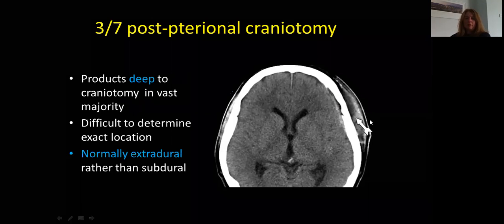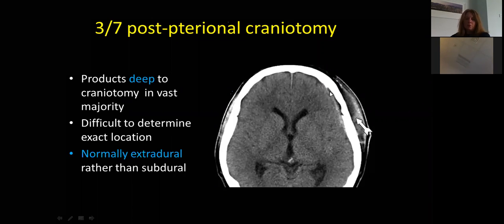And then if you look deep then to the craniotomy flap, this is really common. So most patients after a craniotomy will have this. They'll have some changes deep to the craniotomy. And it can be quite difficult to say if this is extradural or if it's subdural, but usually it's extradural.